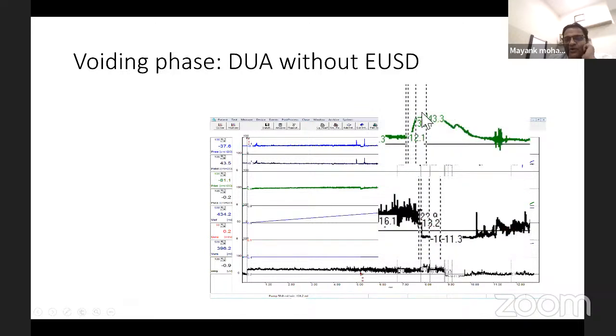It is not a plateau pattern. So you can say that this has underactivity without, at least, sphincter dysfunction. Now, this patient may have prostatic obstruction. You don't know. So you will have to find another way to find where the obstruction is. So whenever you have underactivity, always strive to find whether there is a concomitant obstruction or not.